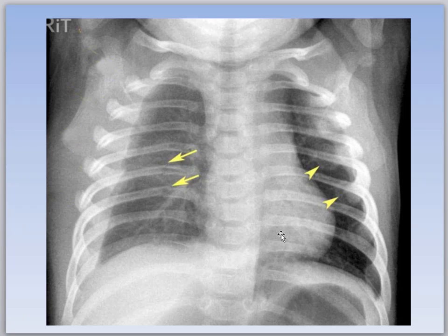Now let's test your skill. I said we won't worry about the lung collapse, atelectasis, which might be going on. Look at the ribs. Are we done with the ribs? Do you see anything? Or are we good? Am I fooling you again? There's some more serious fractures. There's actually 5 of them that you're probably missing right now, and I know you're going, where are they? Where are they? They're right here on the lateral border.